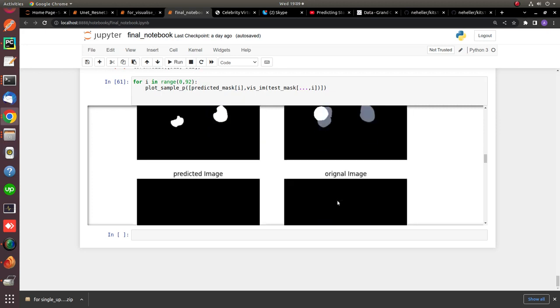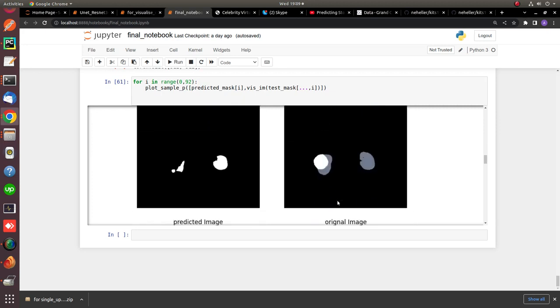This is the 2D plot of the segmented image. Okay guys, I hope I tried to explain it well. If you want further understanding, the number is given on the internet, where one of the data scientists can take a dedicated session for you and explain the functionality in more depth if you would like to understand.